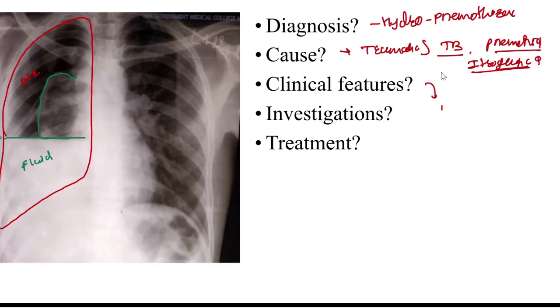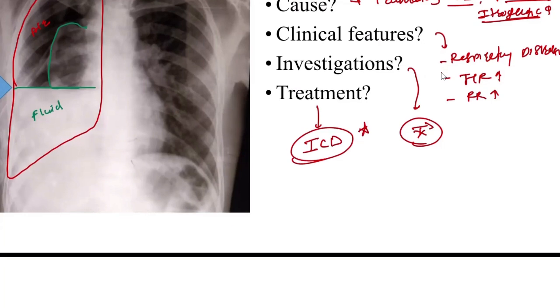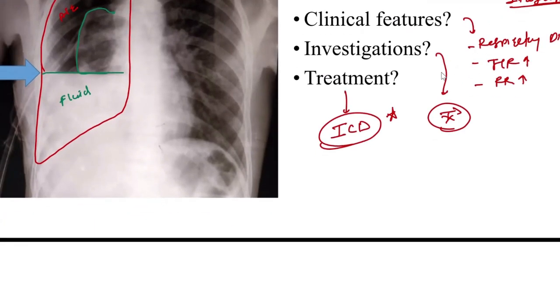The investigation: X-ray is sufficient to diagnose the hydropneumothorax. Treatment is to insert an intercostal drainage, ICD insertion. This can drain the fluid.